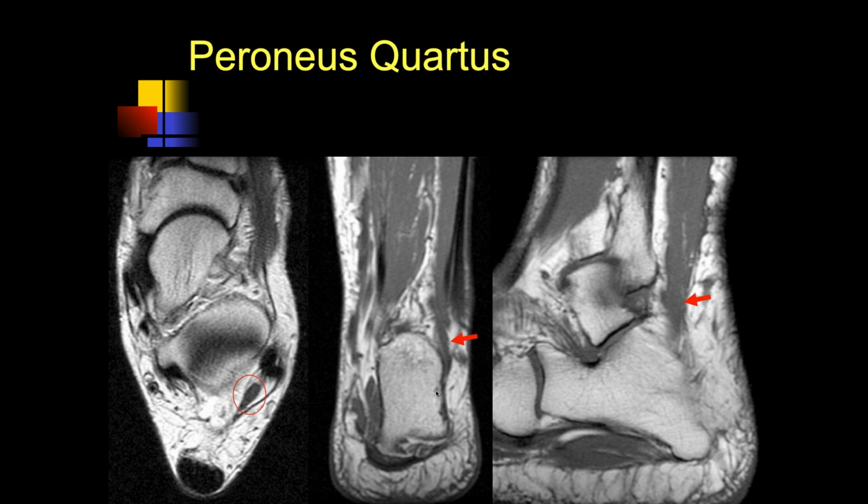Now, is that why the MRI was taken, or is it because of pain of some kind? No, this was just an incidental finding. That's what I figured. But the plantar aspect of the calcaneus, is that normal? Down here? Yeah. Yeah, it's a little bit irregular. No, that's probably not entirely normal. Right in here. That could be painful. Okay.